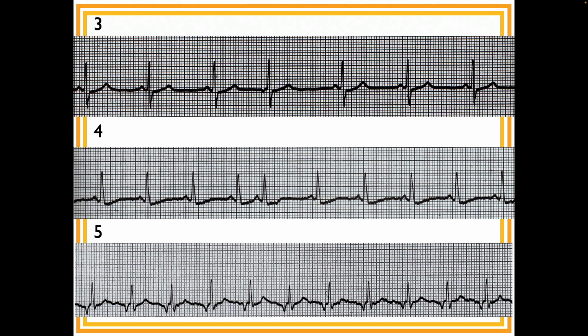So what's the underlying rhythm? Ignore this section here, because this is the oddball, and let's just look at the second half. That shouldn't be hard. I know you can do it, because you passed your quiz. Then it must be sinus. Yeah, it is sinus. It's got upright P's. We said that it was about 60, so sinus borderline normal, sinus possible Brady.